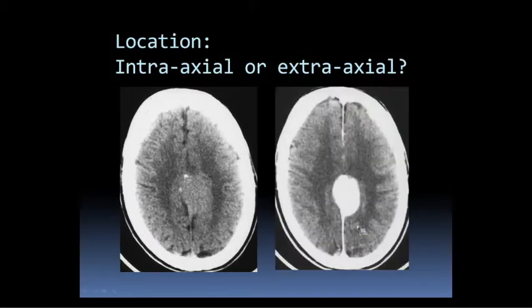And here, this is after contrast. We see this was very homogeneously enhancing, which is typical for meningioma. You can see it's based along the falx, the falx cerebri, and there's a tail of enhancement here. That's also classic. It's called a dural tail. It's very classically talked about with meningioma, but it's actually not specific for meningioma. It really just tells us that it's a dural-based mass, rising from the dura most likely.